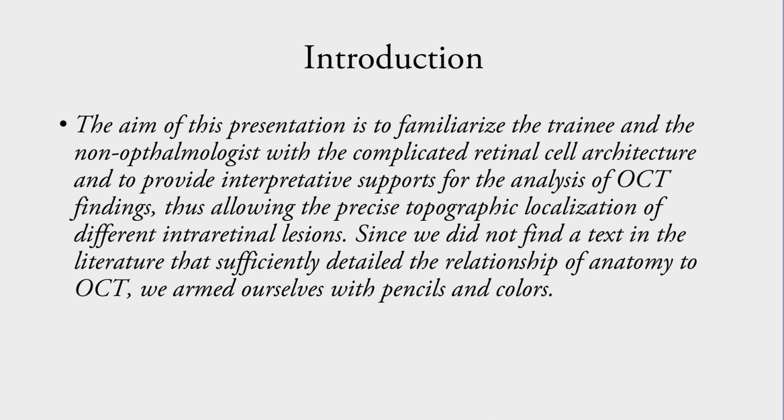Those of you who have never had a small doubt about which retinal layer the deep vascular plexus runs into, cast the first stone. This brief compendium serves precisely as a grip to always have at hand to dispel any doubt.